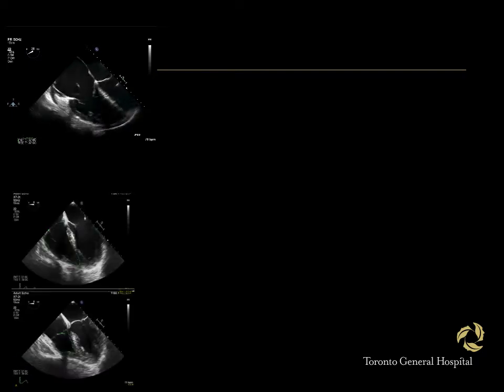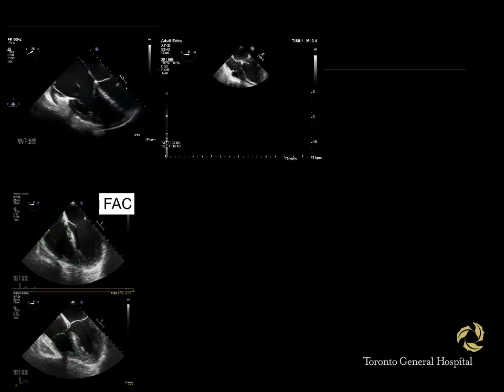When it comes to assessing the change in area, or what we call fractional area change, with transesophageal echo we're pretty good as long as we have good resolution, as in this picture, which obviously is not my everyday echo. I picked the best echo I had. And so you can trace your endocardium in systole and diastole and calculate the change in percentage.